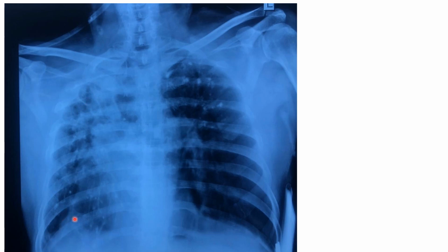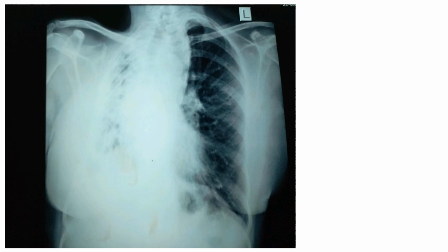And you can see this diaphragm. It's tenting of this diaphragm. This is the juxtaphrenic peak sign. So it is tented, and because of the pull of the fibrosis, it's going up. So you see the trachea is up here, and this cardiac shadow is supposed to be here because it should be on the left side. It does move to the central area and towards the right. So there is a right-sided volume loss.